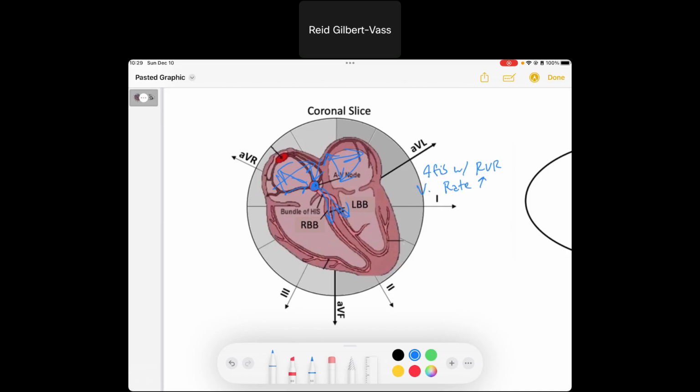And so it's all about the health of this AV node. The AV node is what's conducting the signal down. The atria are going to continue to fibrillate and bump and send signal down, and fibrillate and bump and send signal down. And so it's the AV node, however fast the AV node's going to conduct that signal is how fast our rate is.